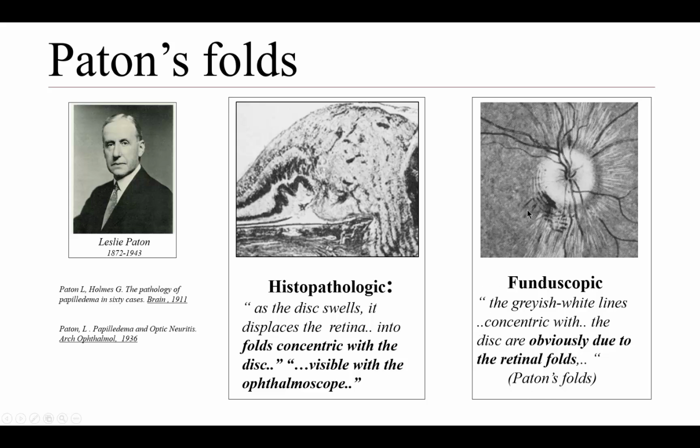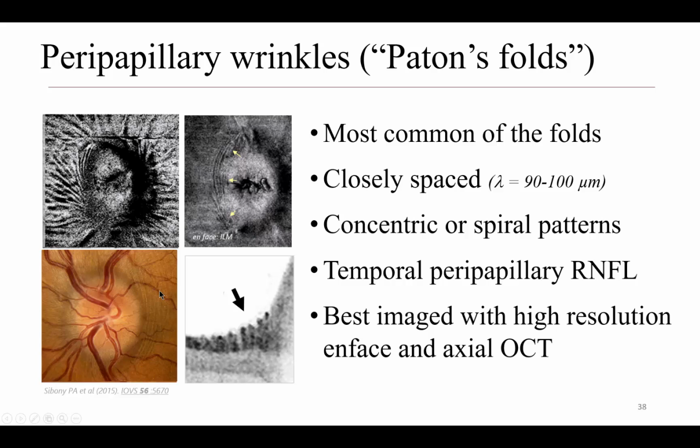And he equated these folds with these folds. Now, although it seems a little bit ambiguous, he seems to suggest that the two are identical. However, if Paton had an OCT and photographs, I'm sure he would have realized that these two are not the same. Let me show you why.